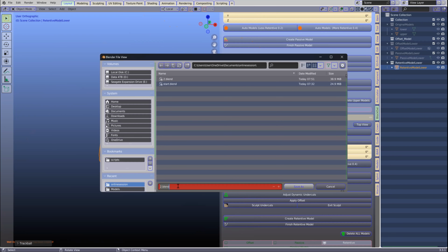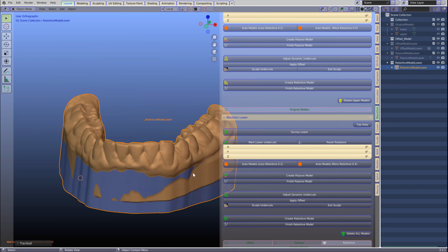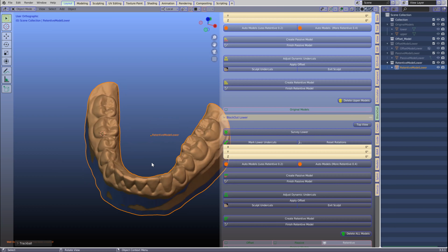Have you got any questions so far? So far, so good. But after you show me this, I'll probably need you to go back and show me again the condyle part. That part's crucial for me. Yeah, I've made this recording, but I can also make another short video of how to set the jaw forward. Okay. I've got to edit that blue object to put some more increments in there, to cater for your procedure.